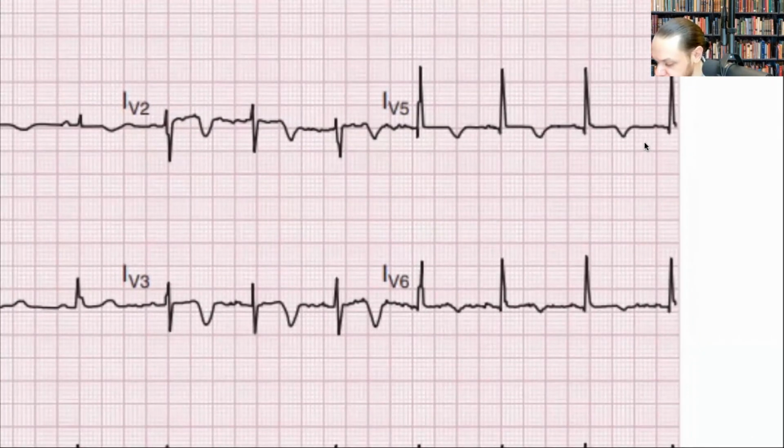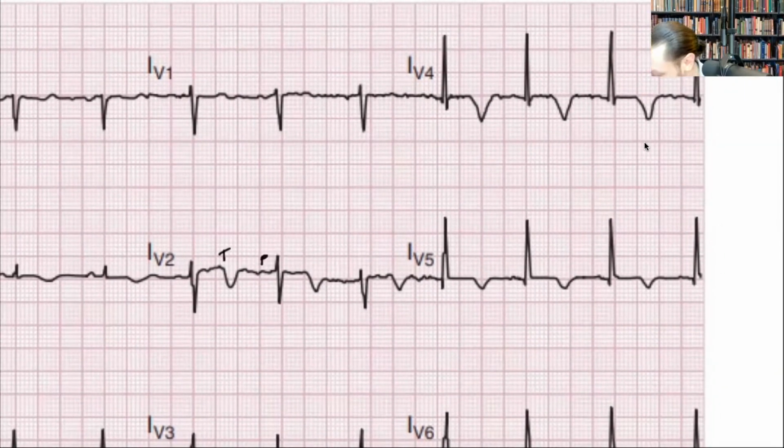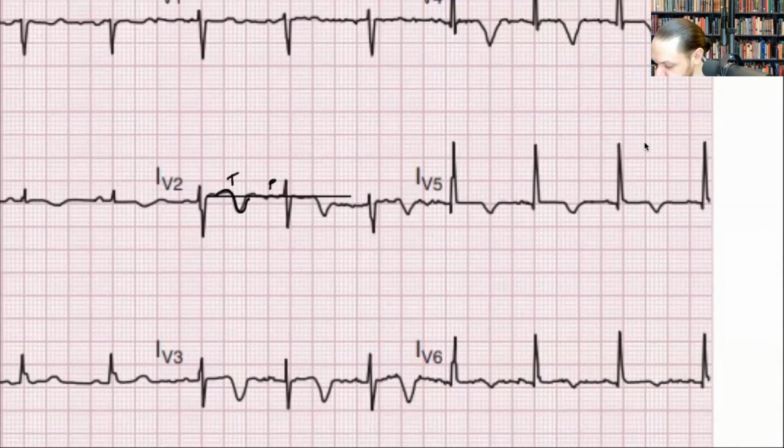So if, let's say, this is your T-wave, this is your P-wave, and if I were to draw my isoelectric line, here you see on this particular one, you see how it's biphasic? It goes up and below my isoelectric line, right? So up and over. For V2, you could say in V3 the same, right?